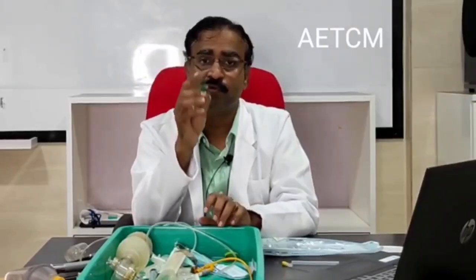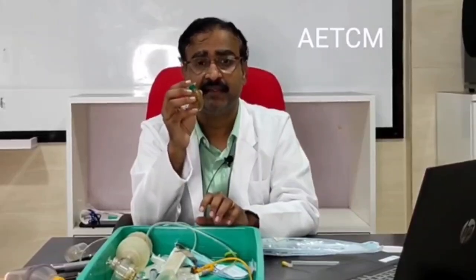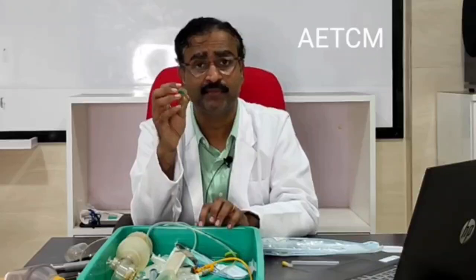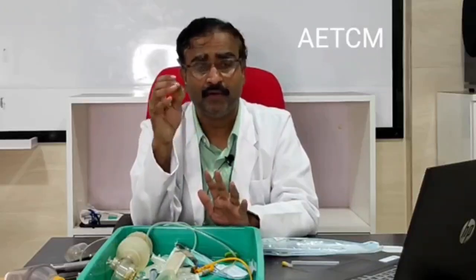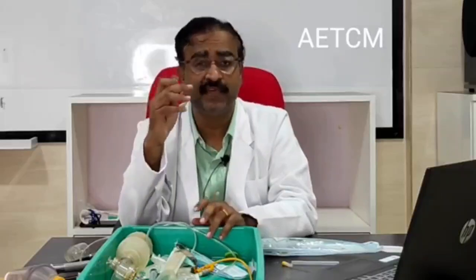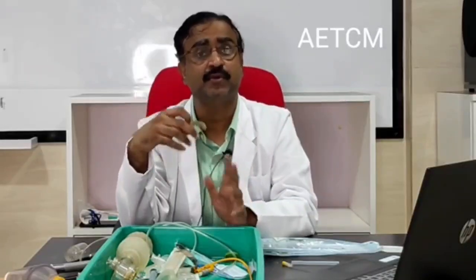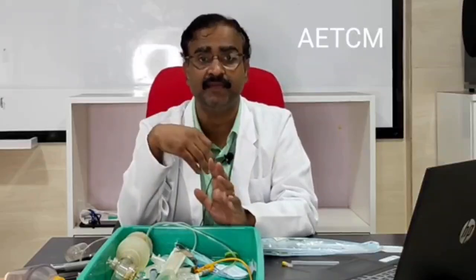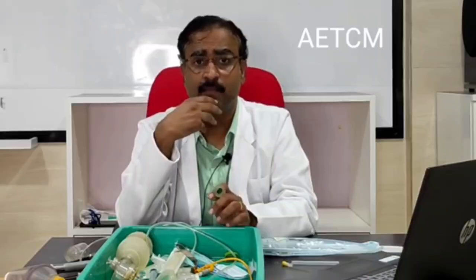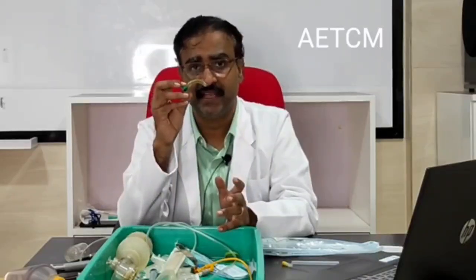You are supposed to use an oropharyngeal airway only if the baby or the child is comatose. Do not use it in a semi-comatose child. You will be causing more problems. To circumvent that problem, you will use a nasopharyngeal airway in a child who is semi-conscious or conscious, and you still need to maintain the airway. So that means if a child has an airway that is getting blocked because of the tongue fall, in a comatose child, yes, you may probably use an oropharyngeal airway.